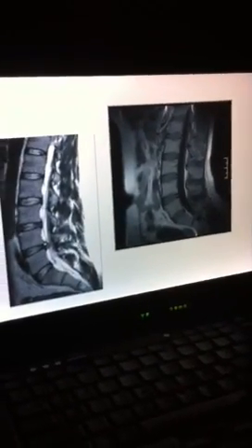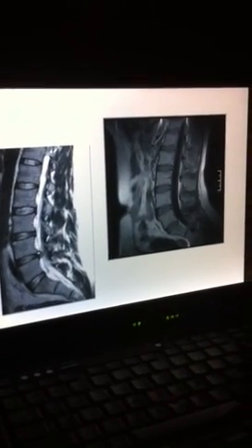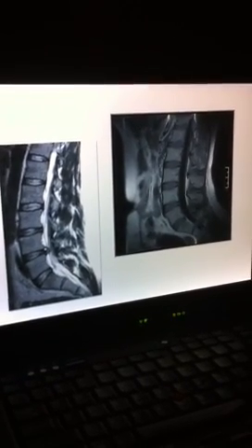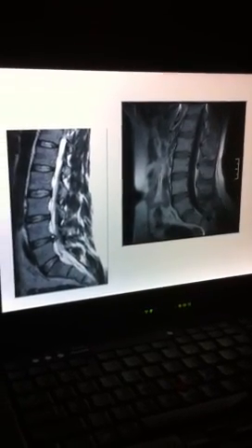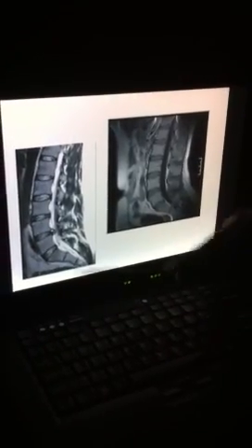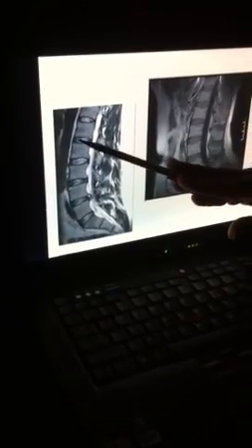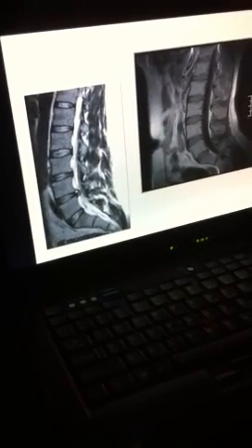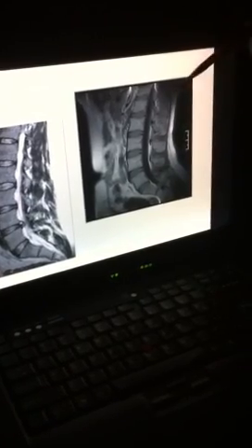Next, we're going to look at a lumbar MRI. So this is just an MRI of the L spine. On MRI, you can see soft tissue structures. For example, you got some back muscles over here, but don't worry, you can't tell what they are without scrolling through, so it won't be a question. You can see the vertebral bodies again. This is the sacrum. You got all the vertebral bodies and the intervertebral discs. You can see possibly some transverse processes. We don't know for sure, so don't worry about that. You can see some spinous processes here.